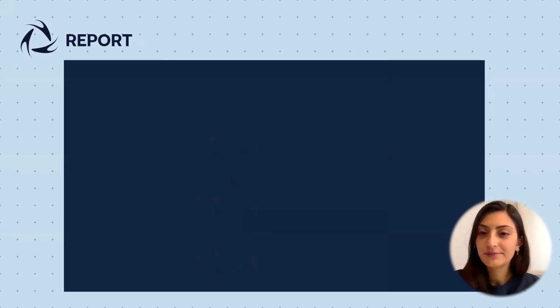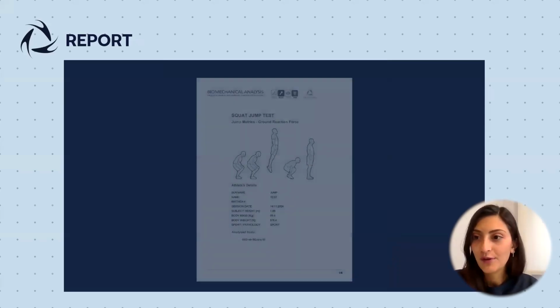Okay, so this was an overview of the report. We show what we think are the main parameters, but if you have any question, any doubt, or if we were not clear at any point, please let us know and you can ask a question. We understand that there are a lot of parameters, and we put everything in just one big video. But also, this webinar will be available online, so you can check it later and see if you have any other questions. You can always reach out.